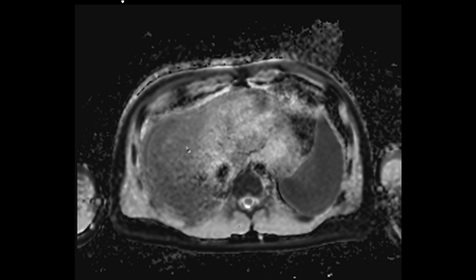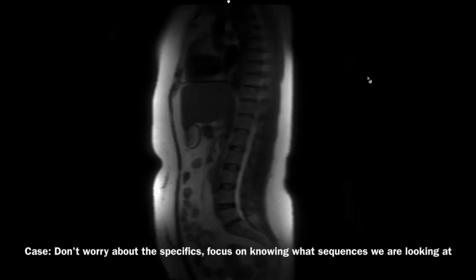Okay, so that's it for a normal abdominal MRI. We've gone through the sequences, and shown you what the tissues generally look like on a normal MRI abdomen. Let's go through a quick case, and then we'll call it. Okay, so this is a quick case that does have abnormalities in it, and we won't go through everything, but we'll go through it briefly.